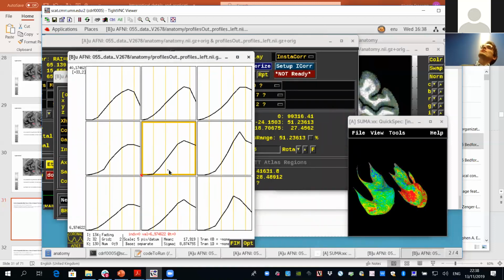Then you see that as you move across the profile, there is the classical, typical profile of BOLD, from the white matter border to the CSF, with the steep increase that I also showed before for BOLD, right? So you have these three interdependent and linked ways to show the data: across the surface, on top of the volume, and across cortical depth, all at the same time, flexibly. This is what I want when I assess and check the results of an experiment, right? Any questions?